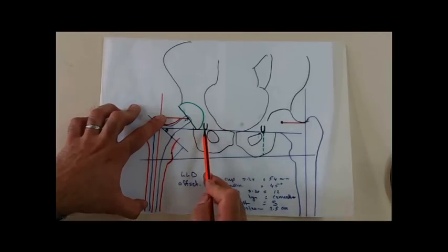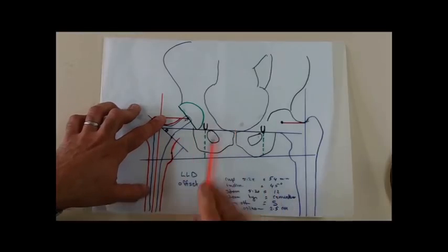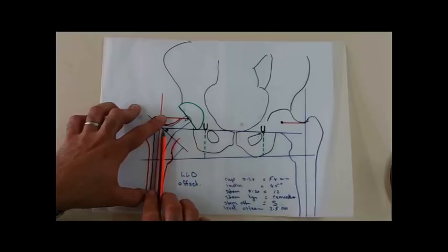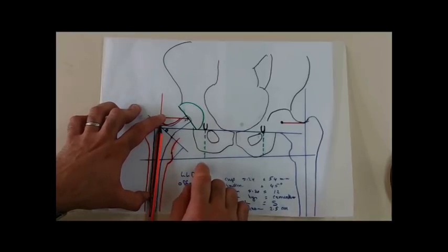If I am still within the safe acceptable limit of limb length discrepancy, I will go forward. But what to do if I face an unacceptable shortening? In this way, I can change my level of osteotomy so that the whole stem will go upward, compensating for the hip length shortening.